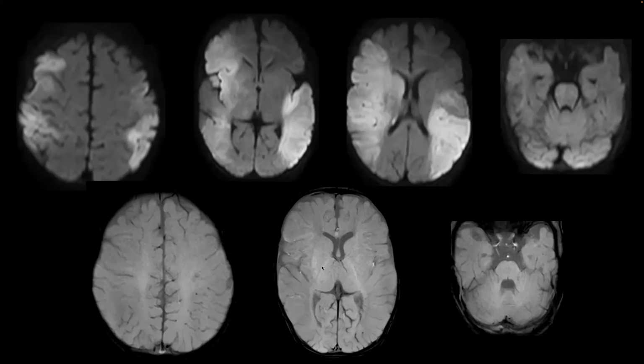It's mentioned vasospasm in favor of that. Yeah, but the arteries are not narrowed for vasospasm, such a significant involvement with almost near normal appearance of the arteries. This imaging was 1 week after onset, am I correct? Yes, 1 week. So you could still, in theory, have some normalization of the vessels within a week.